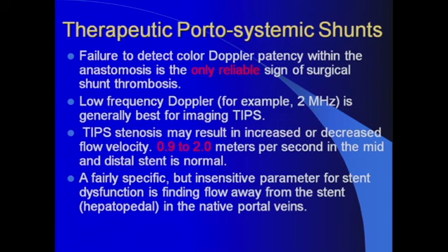The reason why is most of these are covered stents, and these covered stents will have trapped nitrogen air at the time of the placement and procedures that is still not absorbed by the patient and may mimic or simulate complete thrombosis, as ultrasound has difficulty penetrating through air, which will significantly diminish the accuracy of your study and erroneously give the wrong diagnosis.